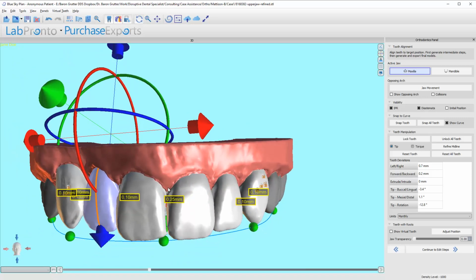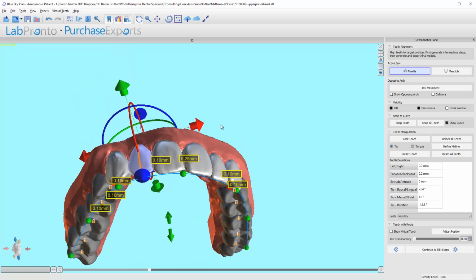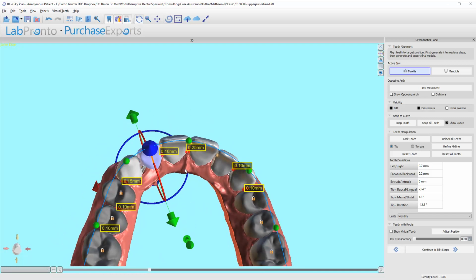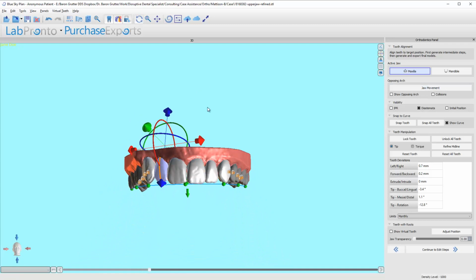There's no real contact. That's in the gingival area where basically the papilla was interpreted as tissue of tooth because they couldn't help it. We didn't give it enough data. So that is where imaging is really important. Right down here is a little bit of embrasure space. So that's that. I'm going to turn off the IPR because I'm pretty satisfied with that.